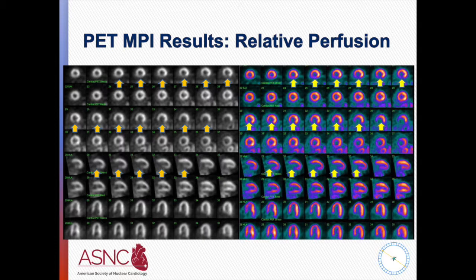The rest of the myocardial territories appear to be preserved, no other perfusion deficits, and there's no apparent left ventricular dilatation noted with stress. Well, what a surprise, eh? A 38-year-old lady, atypical type symptoms. I mean, somebody must have ascertained a sixth sense about this patient being at much higher risk than maybe we would have expected.